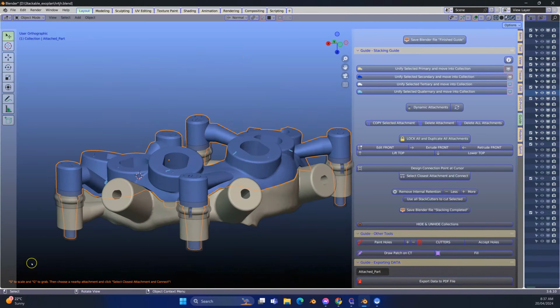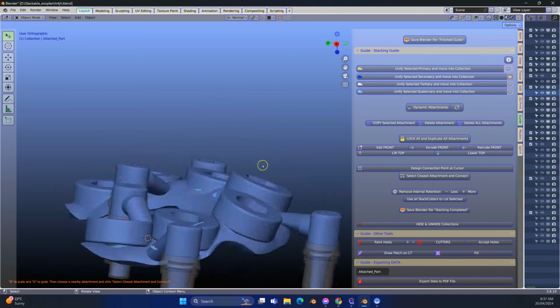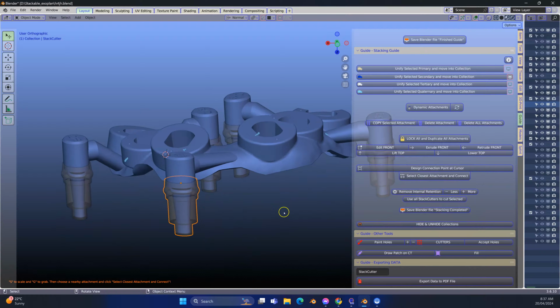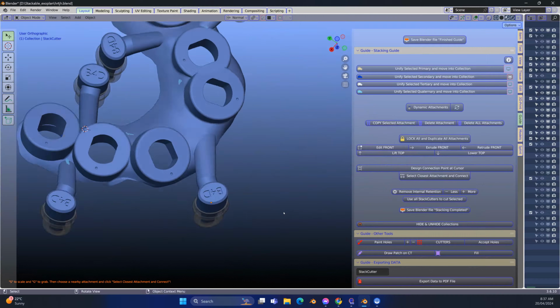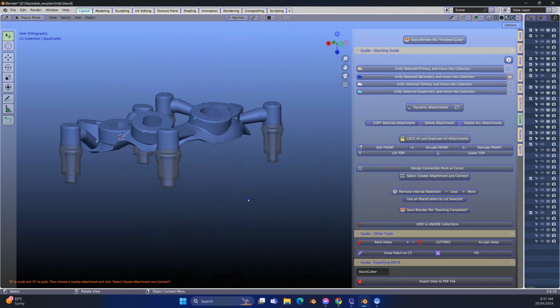So the procedure is the same, and here we're hiding them, and these over here are just the cutters. We don't need to use them at this stage. They are for cutting a layer, which we don't have to do.